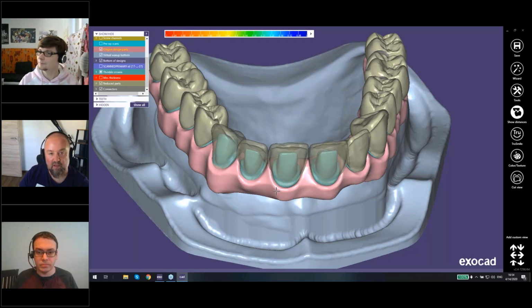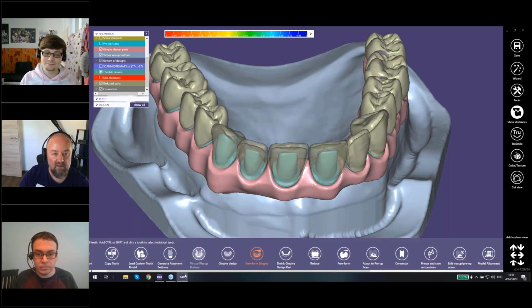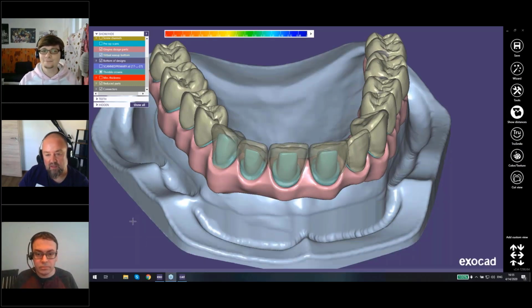Some implant manufacturers would not be very happy with that. If it's an open STL, an open geometry, you should then create in your CAM software your own macro for every implant geometry instead of having the curves directly in the construction info.